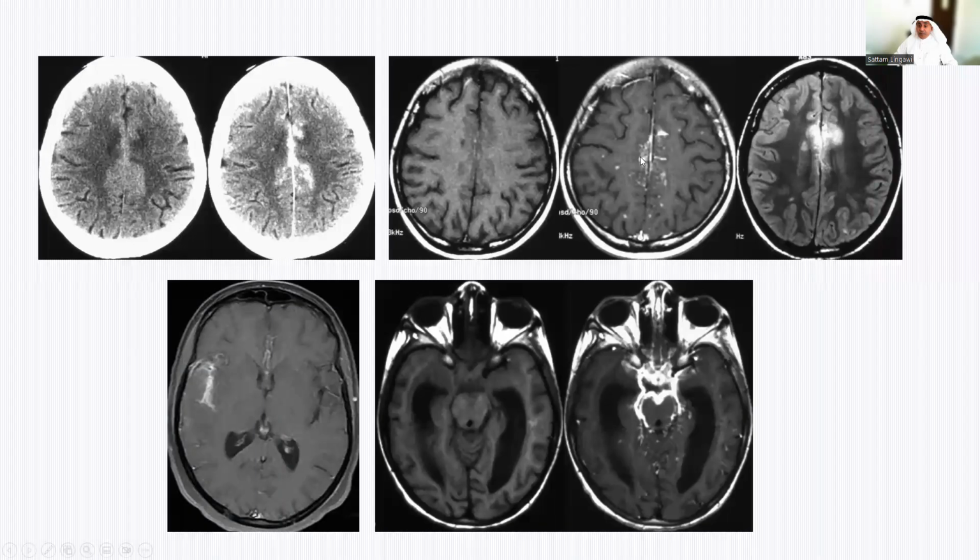You may also see selective areas of meningeal and parenchymal punctate enhancement, indicative of tuberculomas and the surrounding satellite tuberculomas as well. Hyperintense on the proton density with strong meningeal and parenchymal enhancement. You can see here selective enhancement within the sylvian fissure itself, and the strong and fairly prominent ventriculomegaly.